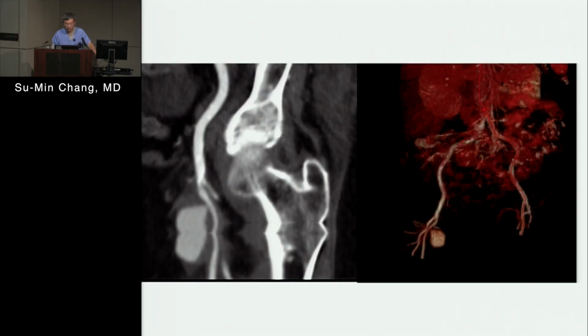So, Mawash, you probably know this case. So, Amen, what do you see? So this is MPR images. Oh, sorry.